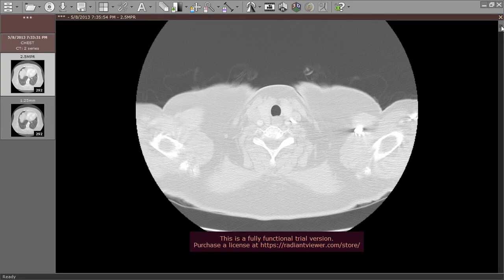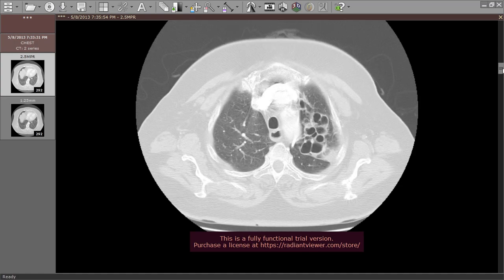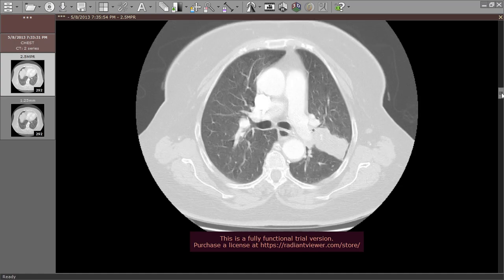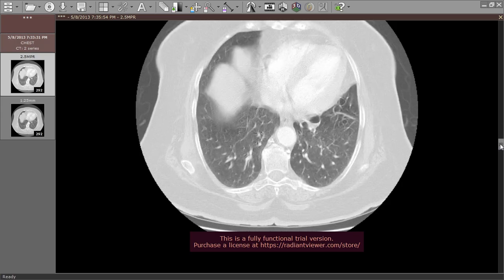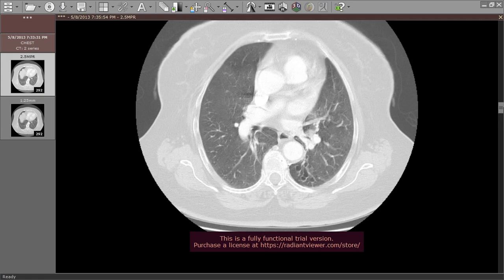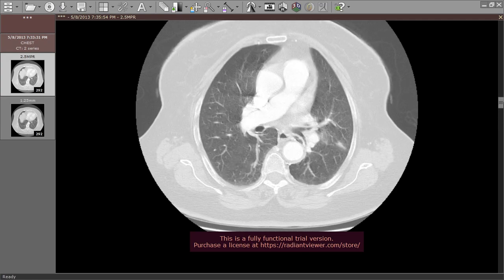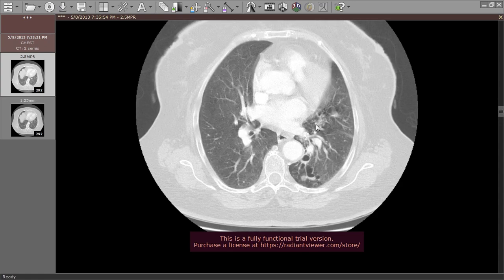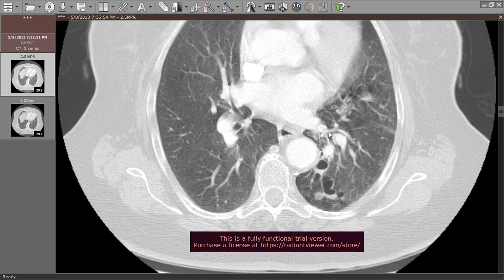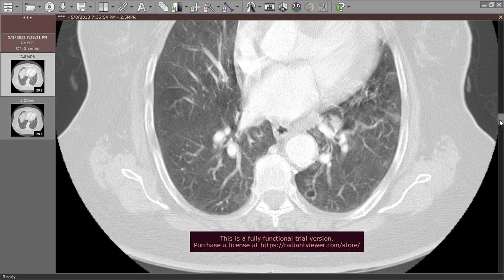Case number 5. Of course, this is the classic typical sign of bronchiectasis, cystic bronchiectatic changes, which are usually connected to the bronchial tree, cystic in shape, circular in shape, with air-fluid levels denoting recent infection on top, and retained fluid secretions.